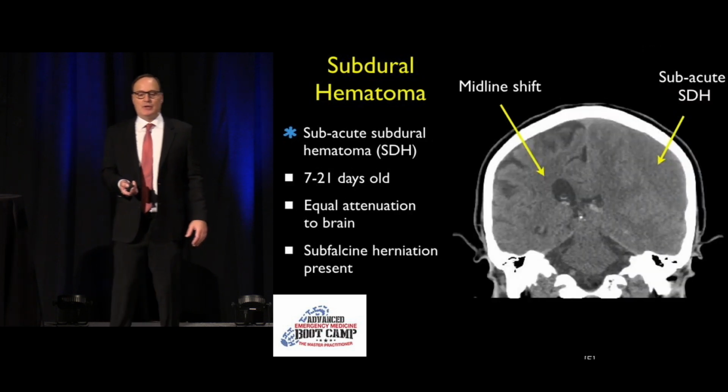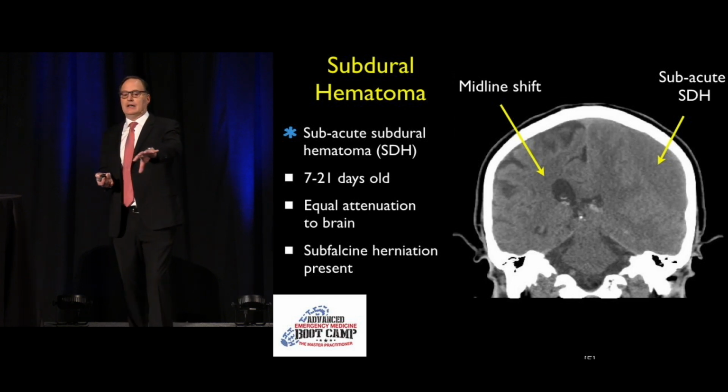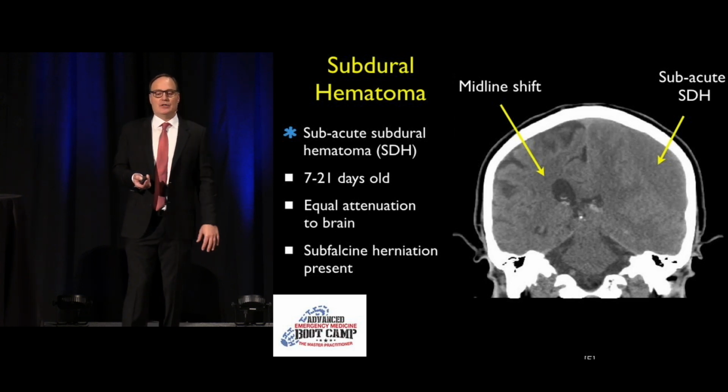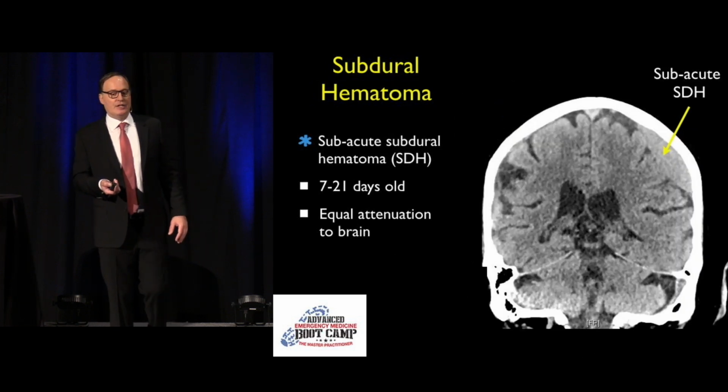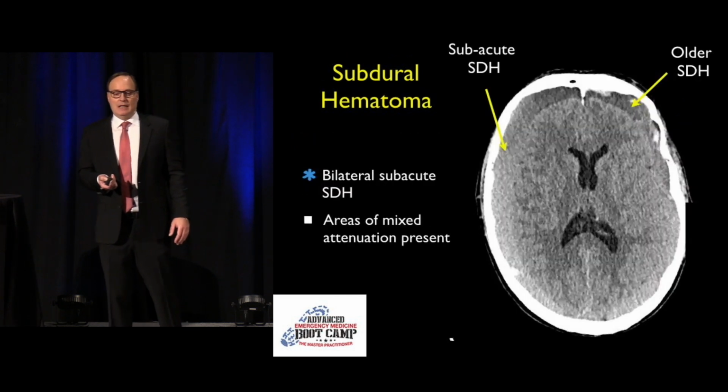Here's just another example where you can see that the brain is shifted. It looks like there's something there, but this is actually a subacute subdural. And you can see, just windowing in with different windows, you can bring out that subacute subdural. Let me come through to this.